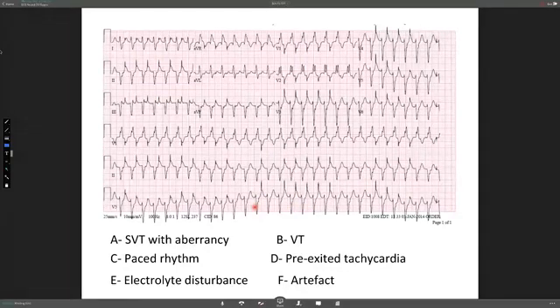With regard to the other question, someone is confused with the shape of the T wave. This is something we discussed. What you see in the T wave here is likely to represent an artifact spike. You don't see it in all leads. For example, if we look at lead 2, you could see that there is a spike here, but then you don't have it here. It's likely to be a limitation of the ECG recording. It's likely to represent an artifact. I'm not sure it's anything more than that. I could reassure you that I ablated this patient successfully, and she does not have a pacemaker or an ICD.